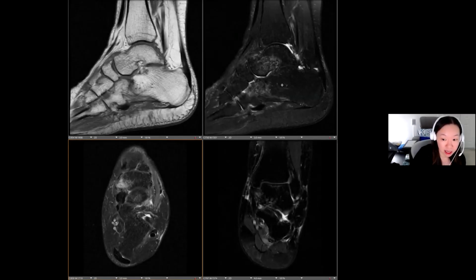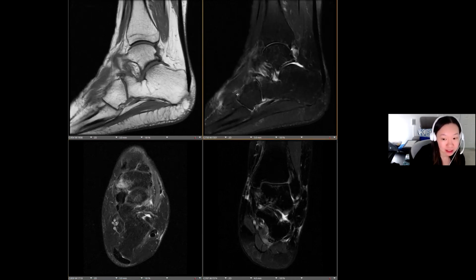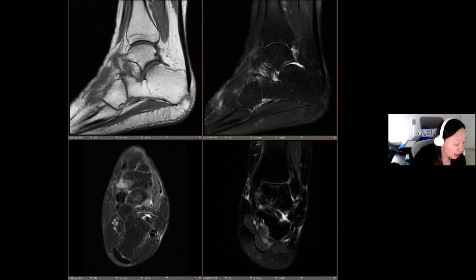This is a 38-year-old woman, another person who fell down steps. There seems to be a lot of that in foot and ankle injuries. Starting again with the bones. So here we can see edema with a little fracture at the anterior process of the calcaneus.